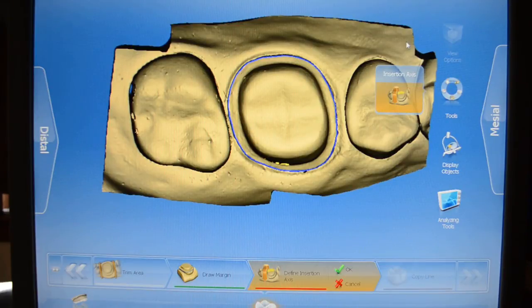That looks pretty good. The other thing is that CEREC is a German company. Sirona is a German company. And Sirona, being German, likes linear. So there's a significant advantage to, in addition to making sure you've got a nice path of insertion or path of draw, to make sure that your central fissure is parallel with the top of the screen. Now, if you've taken nice pictures, it's going to land there anyway.